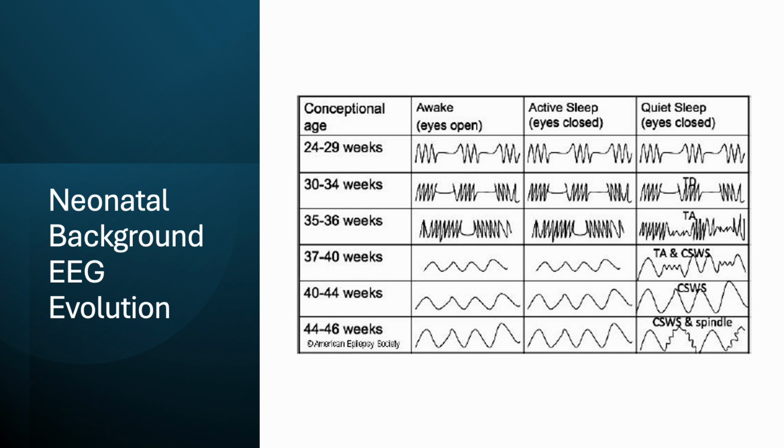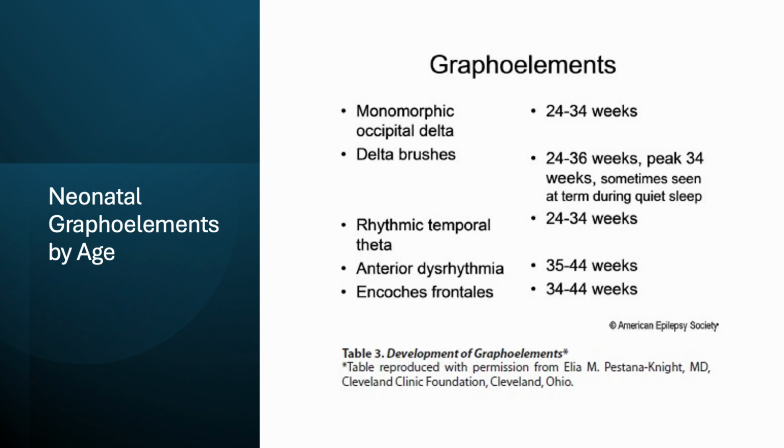Here's a decent summary of what the EEG looks like, very basically, as a neonate develops, and I would copy this table down. Here's another small table talking about a lot of the different EEG elements that neonates show at different ages.